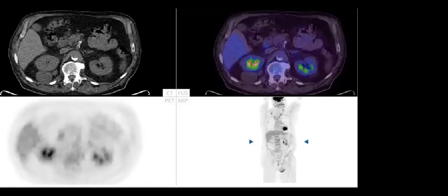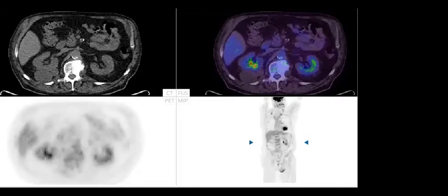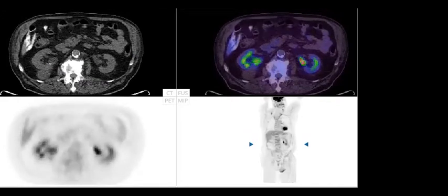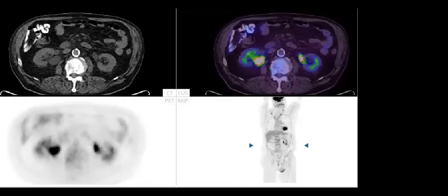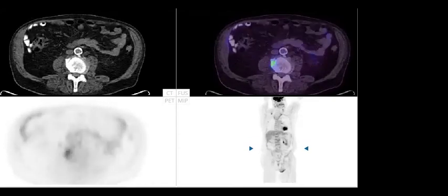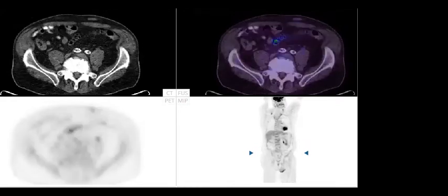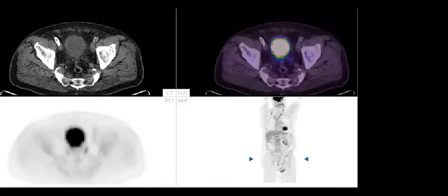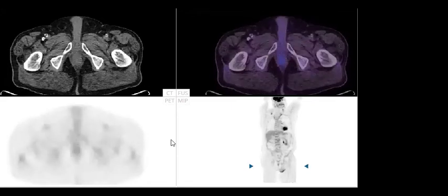And there are some incidental lesions that could appear while you are checking the PET-CT. For example, here, this one could be a renal cyst as an incidental finding, so you should report it and also check whether there is any metabolic activity in this lesion. Finally, you check whether it's metastasis or just an incidental lesion. If you have atherosclerosis in the aorta, you should check and comment upon this. And some of these incidental lesions could be very critical for the patient. If you find gas, or something like an emergency. Okay, so this is the quick introduction.